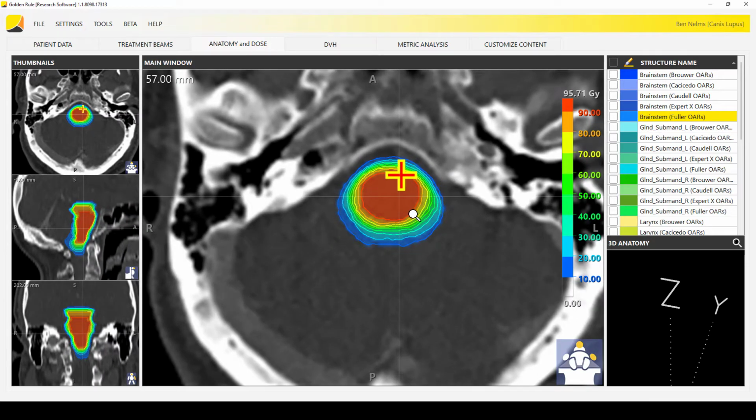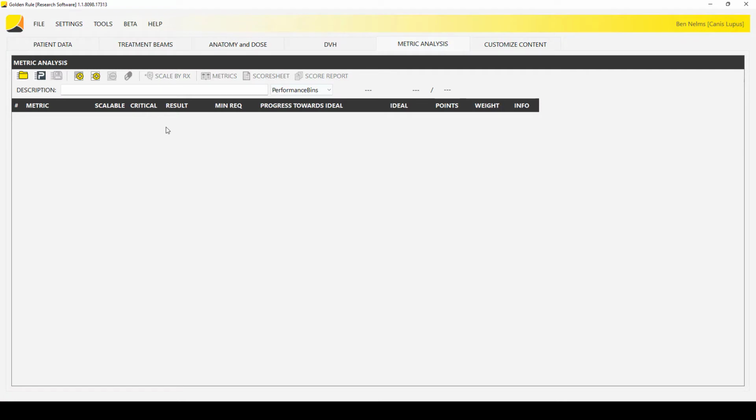Now, to study the contours of an individual expert versus the consensus, we'll put it back in axial. But before we do that, let's calculate the consensus gradient index, 20% agreement divided by 80% agreement. I've got these dose metrics, and I'm going to treat it like a dose.